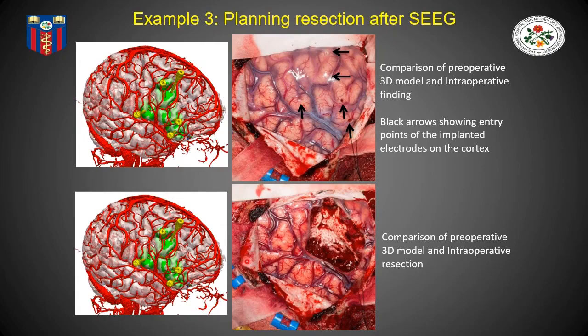And here you can see how the post-op picture of our cavity is very similar to the volume that we gave to ourselves to be removed during the operation.